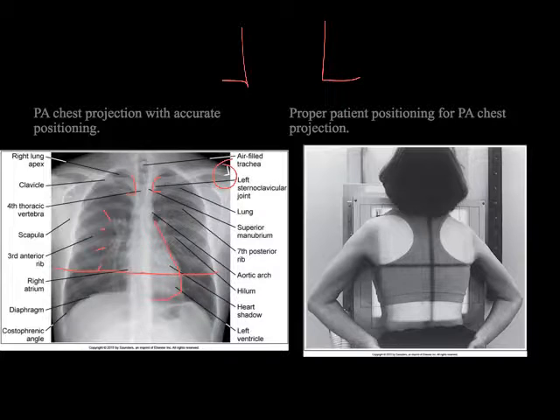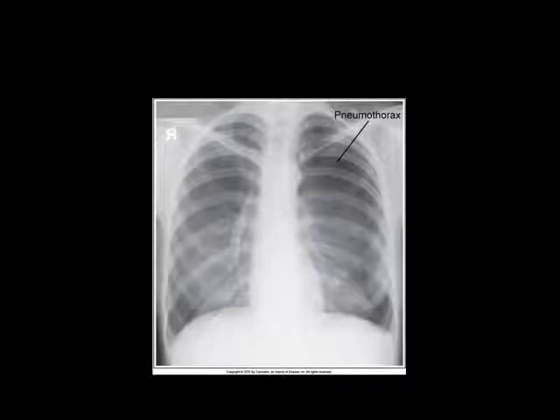As we do these evaluations for image criteria, it's helpful because this is going to be the building blocks towards comparative pathology. So what I'm interested in here is for us just to articulate what we're seeing, and to be able to describe, positioning-wise, what we're seeing.